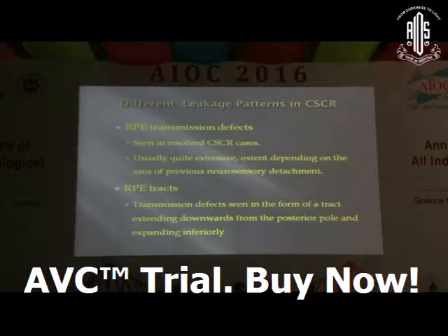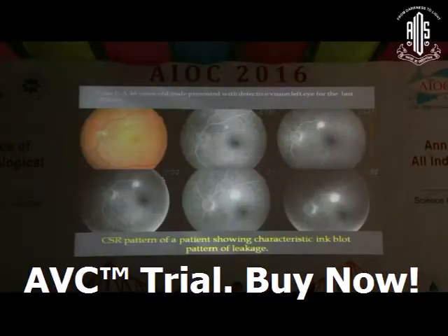Then there are RPE transmission defects. They are seen in resolved CSR cases, usually quite extensive. The extent depends on the area of previous neurosensory detachment. RPE tracts are the next pattern. There are also transmission defects seen in the form of a tract extending downwards from the posterior pole and expanding inferiorly.